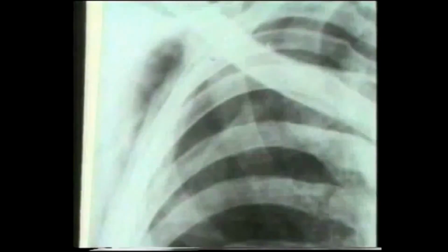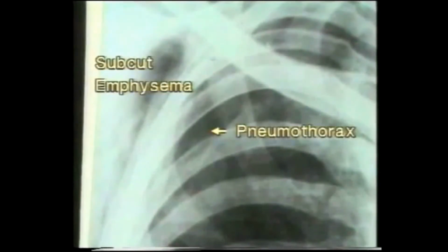This X-ray shows surgical emphysema which results from a pleural tear secondary to rib fracture and leakage of air into the subcutaneous tissues. Note the fibers of pectoralis major that are so clearly lined by the air, and the air in the subcutaneous space surrounding the chest wall. A careful inspection shows a small pneumothorax and border of the partially collapsed lung.